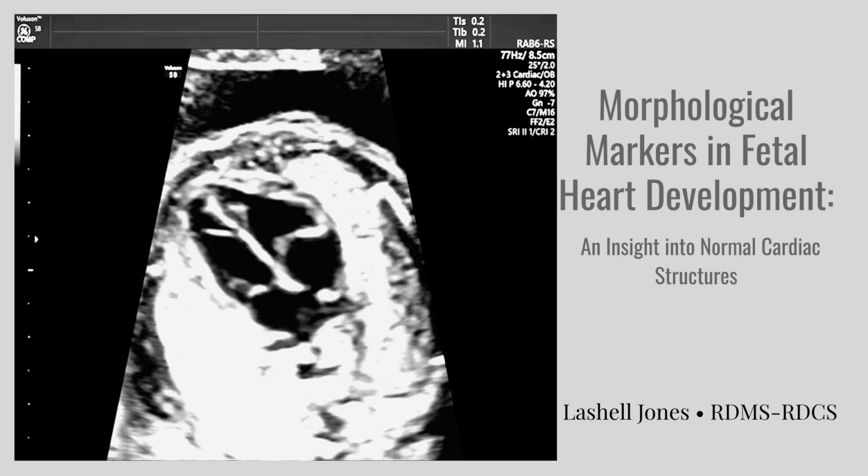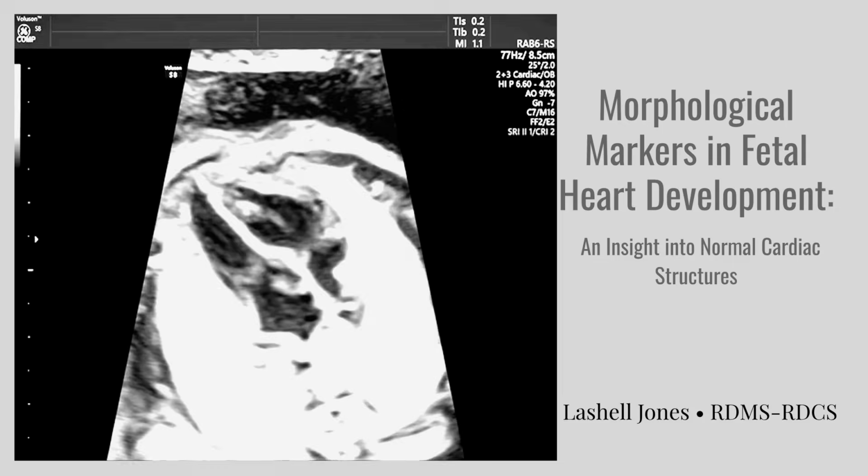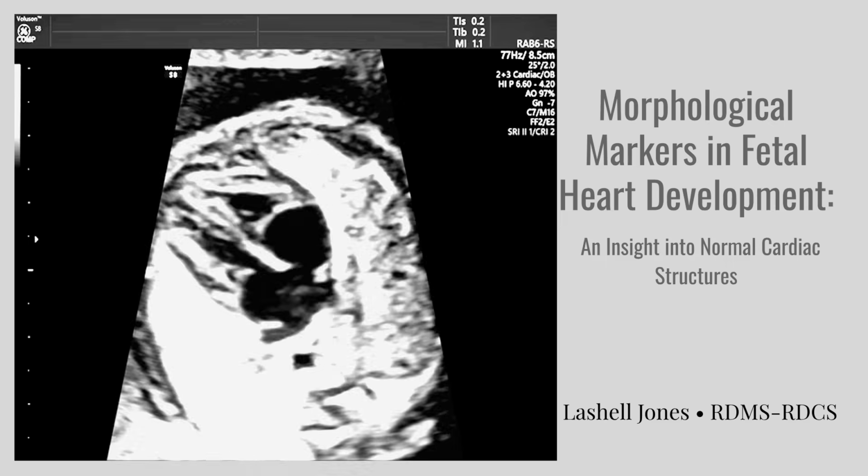Welcome to this video on morphological markers in fetal heart development, focusing on normal cardiac structures.